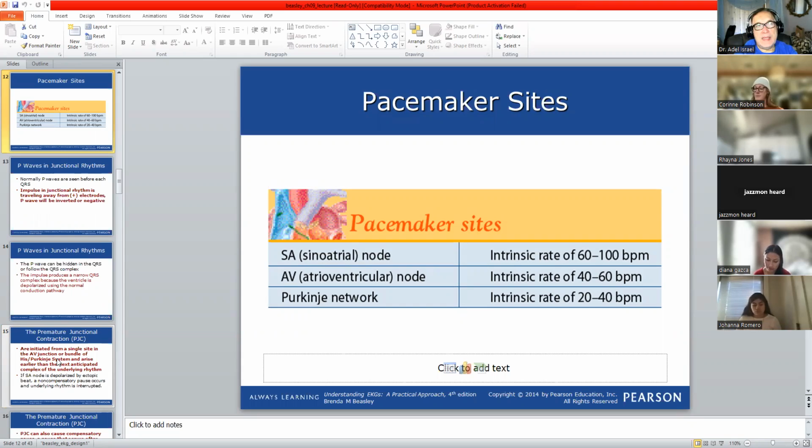And as I told you yesterday also, if it is increased to more than 60, pay attention, I will give the word accelerated, until I reach the number 100, then I will give the name tachycardia.